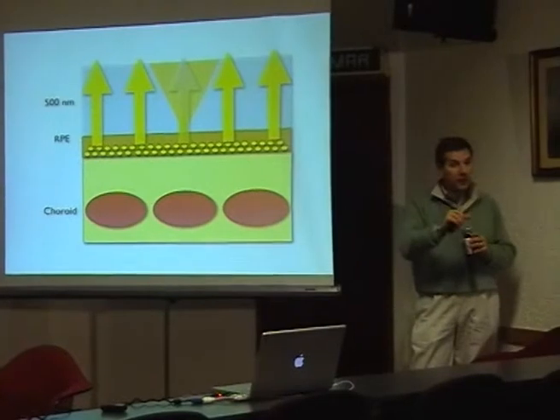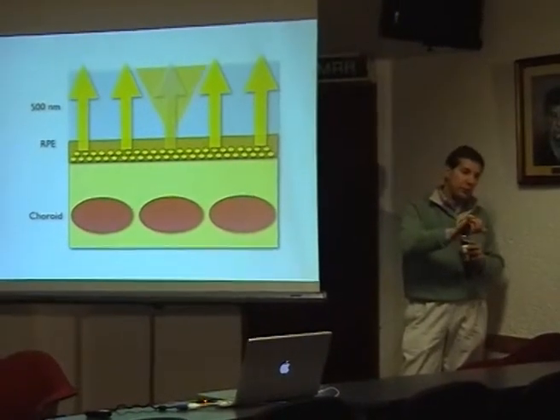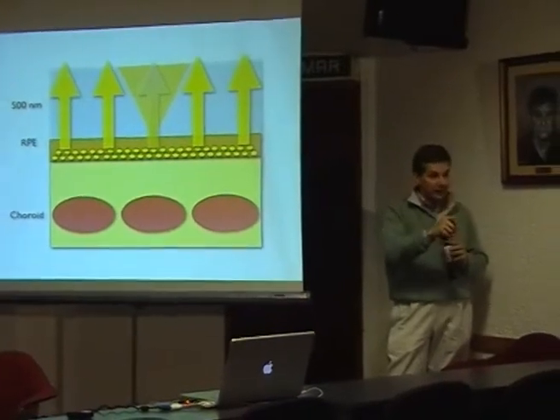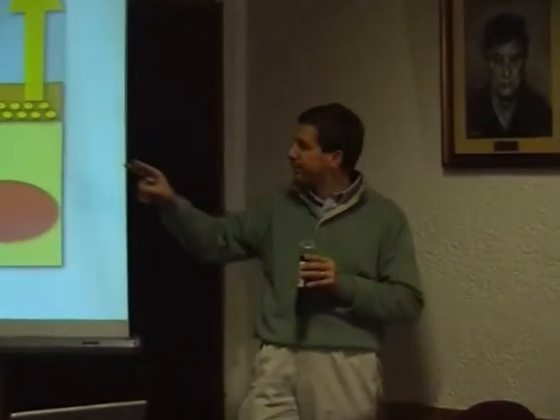And then there are the autofluorescent images that are taken from the Topcon or the Zeiss cameras that are completely different. They are between the 488, so the blue light, and the near-infrared. I will show you the example later.